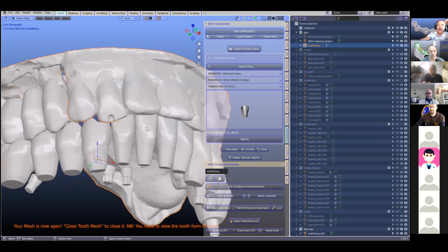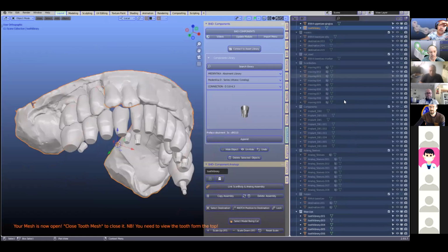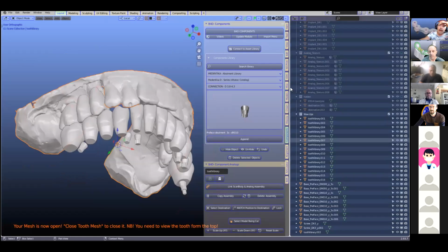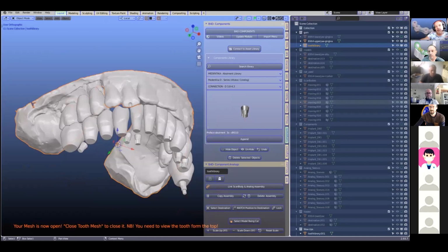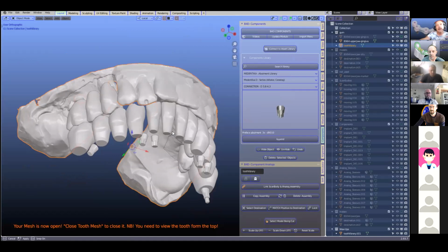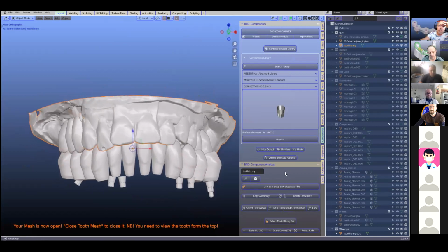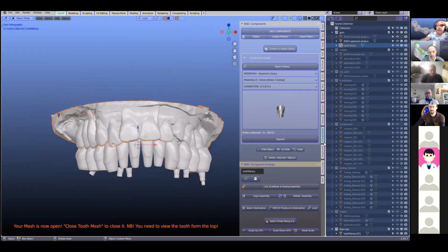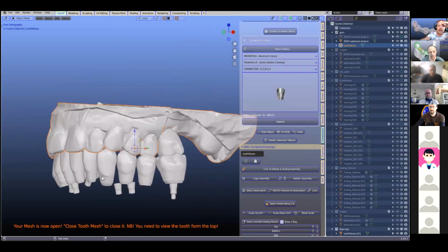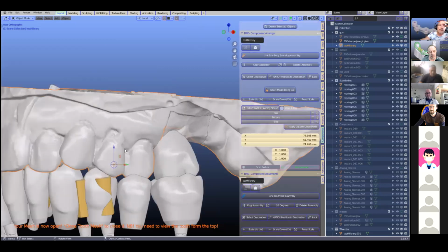And I find that quite a bit easier because you can see how many objects we've got in the scene. So to simplify it, take your tooth library, export it, start a new one, put it in the articulator, cut them, and then import them back in. I find that the easiest way to do. Now, also in the scene, I've aligned the scan bodies and the components have all been aligned to the scan. So I'm not going to go through how that works.